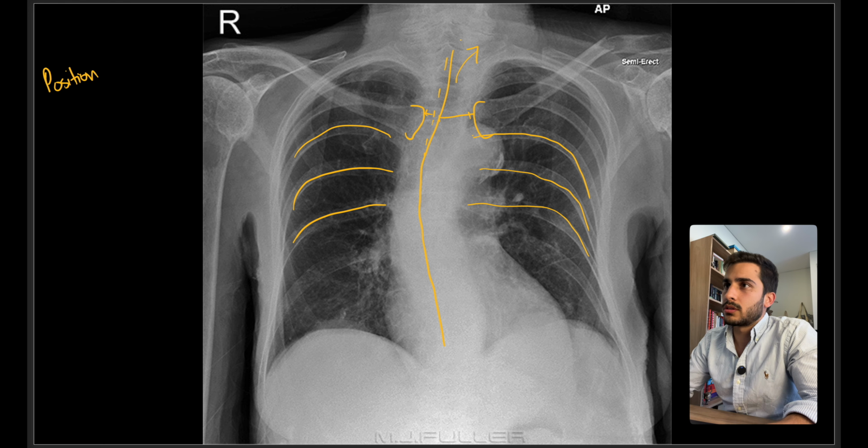Are they really hunched down or leaning back? How many ribs can we see? Again, this one's a bit difficult. So that's rib number 1. That's rib number 2, 3, and 4. Okay. If you missed that, let me do that again.